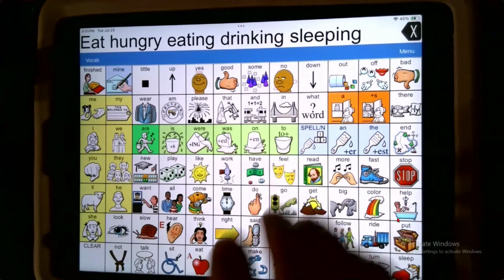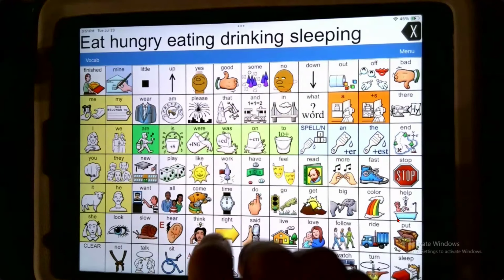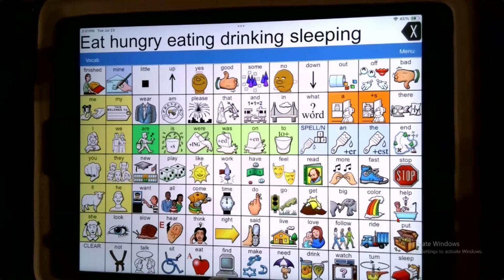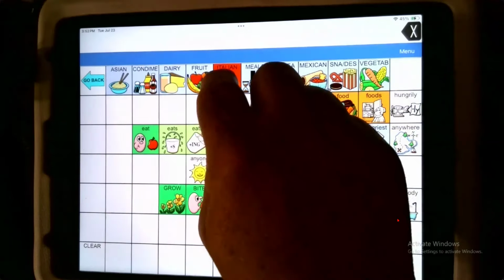Many kids need some words at one hit, some words at transition, but they need lots of foods, lots of toys, lots of TV shows, lots of shapes, lots of Disney characters. So I want you to know that you don't have to put a kid on one hit, transition, or full. We have something called LAMP 1, 2, 3. And I've actually taught you everything you need to know how to do this, but before I do that, I got to show you that right now I'm in the full vocabulary. You know that because I'm getting all those foods.